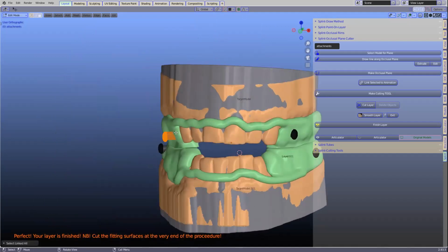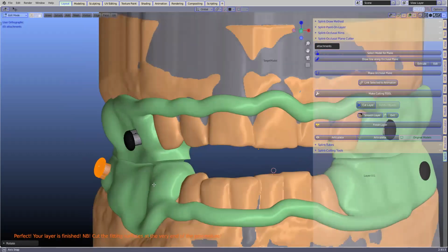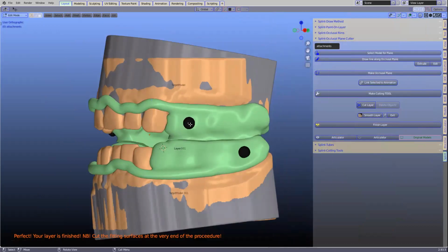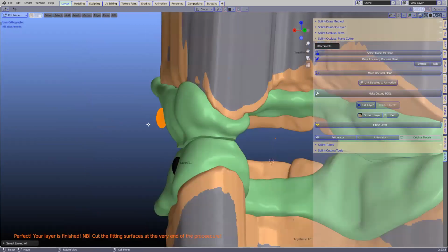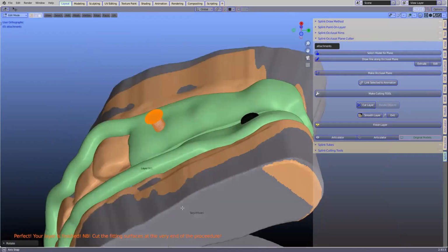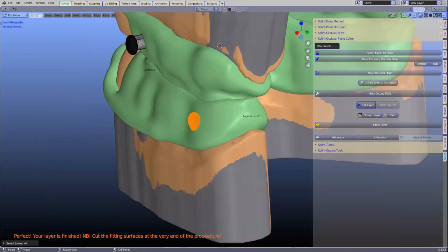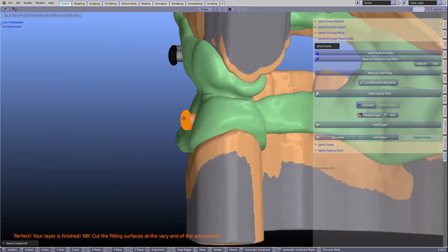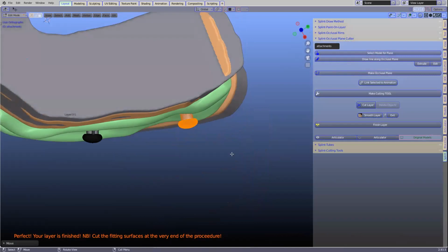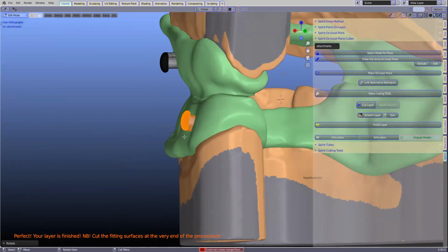So Control L, look at it. You can go R on the keyboard. Notice my proportional editing is on. You don't need it on because we've linked them all together. If you've got proportional editing on, you may move the other attachment depending on how big your circle is. Control L, look at it, move it out. I always look at it from perpendicular. So you see how I manipulate my view, because it rotates according to my view. Control L. So in order to bring that out, I move it to this side and use the G key, you see? And then, of course, I want to move it this way or that way to rotate it. So it's always perpendicular, okay? So just say I'm finished with that, okay?